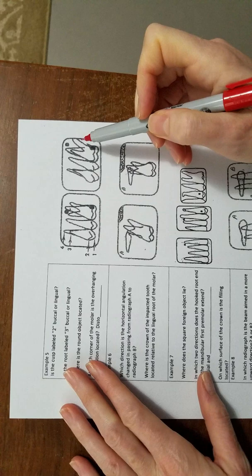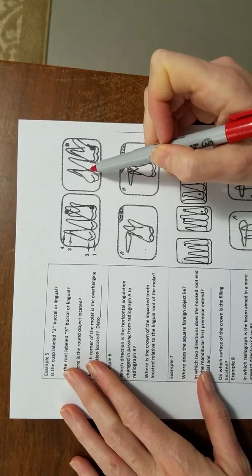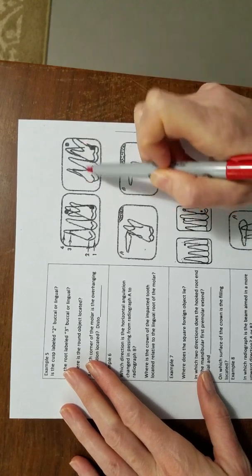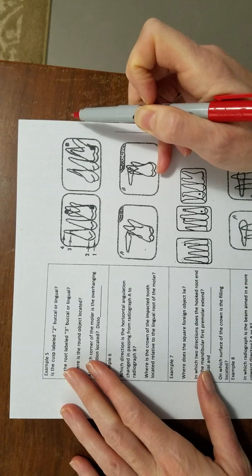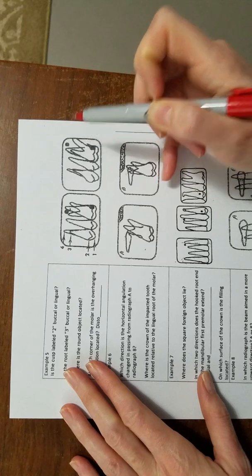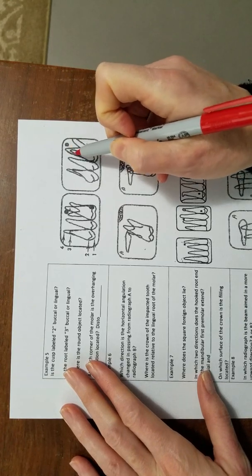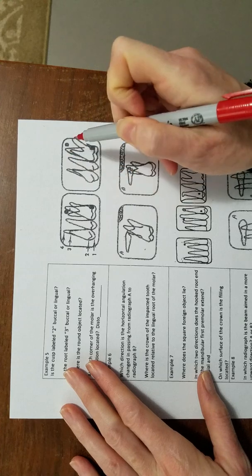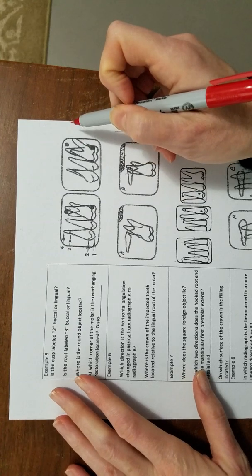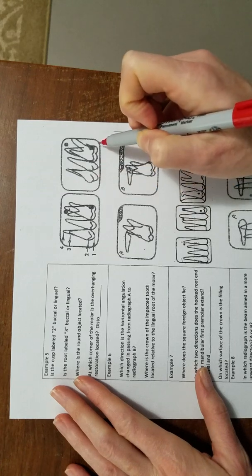And so if we look at what's happening here, we can see that certain landmarks are leaning more distally. And so anything that's leaning more distally, we can assume is buccal. Well, we don't assume it, but we know that roots tend to lean toward the direction of the beam. And then this, which is generally our palatal root, seems to be going in the opposite direction, so that sort of confirms it. Our palatal root is going opposite of these two roots here, and then the elongation of the buccal cusps tends to be leaning toward the distal as well.